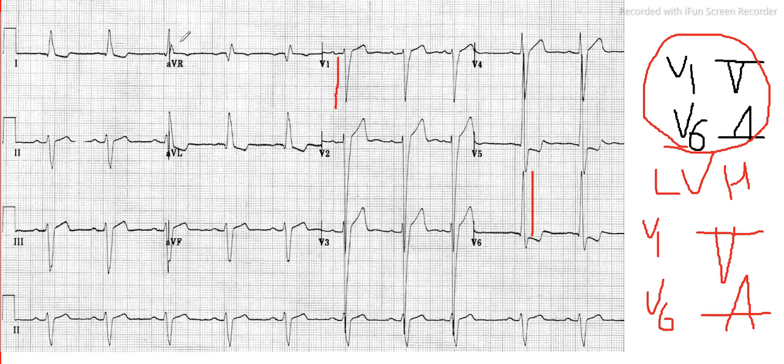Now from the axis also you can determine whether it is right axis deviated or left axis deviated. In case of left ventricular hypertrophy, there will be left axis deviation. For that, I will draw lead 1 here. I will draw a straight line, so this will be our lead 1 representation. Okay, this is lead 1, and I will draw another. This is lead AVF. Now I will draw the vector representation upon them.